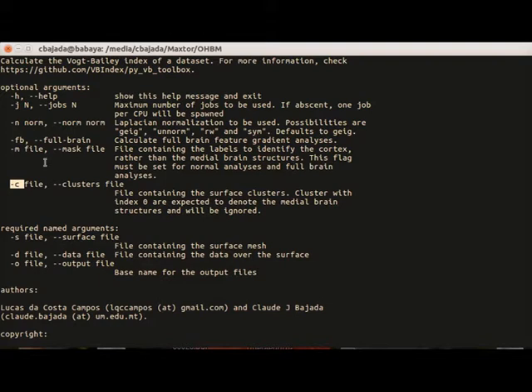Okay, the second file, which is closely related to the C flag, is the M flag. This is useful when you're doing the full brain gradient or the searchlight VB index, and it defines a mask of where your cortical vertices are. Again, this is very similar to the clusters, but consider the whole brain as one cluster, and the 0 values again denote the midline structures.